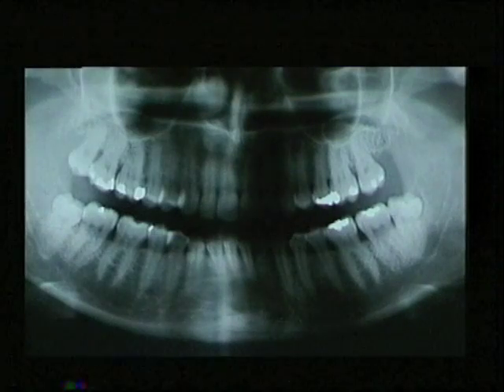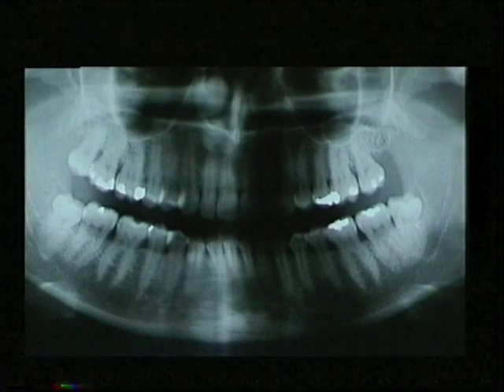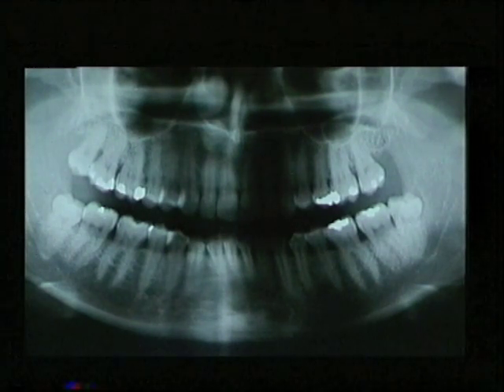I'm not going to talk about these, but in the first video I shall deal with classification of third molar impaction based on radiographs. The OPT is a pretty useful view of both jaws and will certainly show the presence of impacted third molars, and to some extent their degree of impaction. But it's not as reliable as you need. So, use an intraoral periapical view as well, as this will give you the necessary detail.